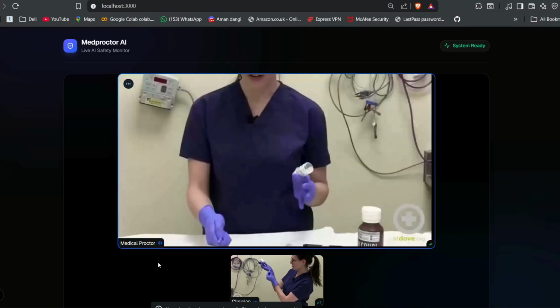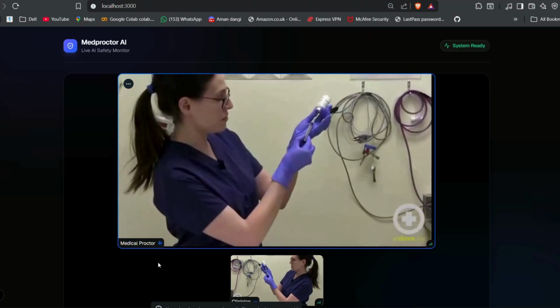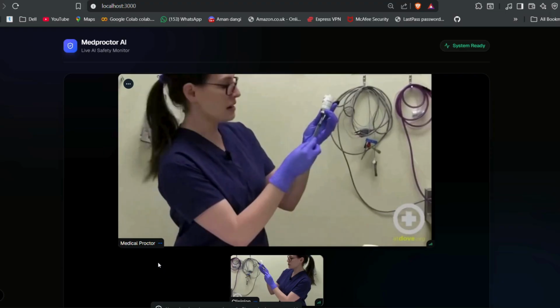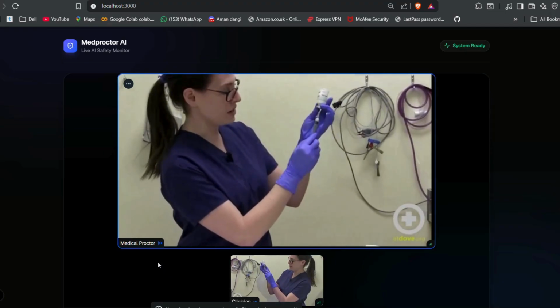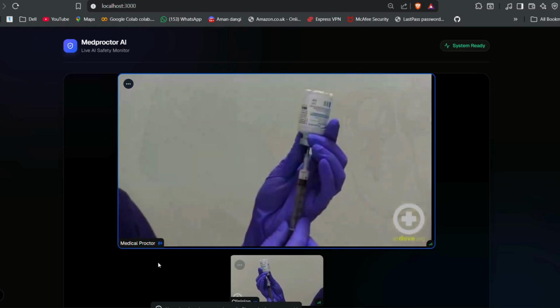I am ready when you are. The video is currently blank, so I cannot confirm PPE yet. I see you are wearing gloves, but I don't see a mask. Please ensure you have proper PPE in place before proceeding.